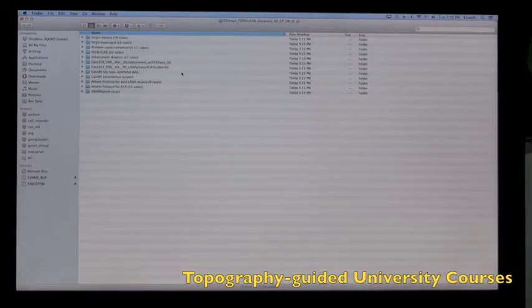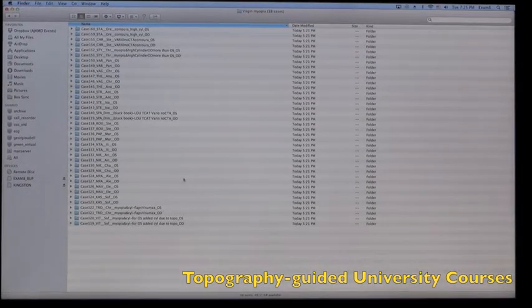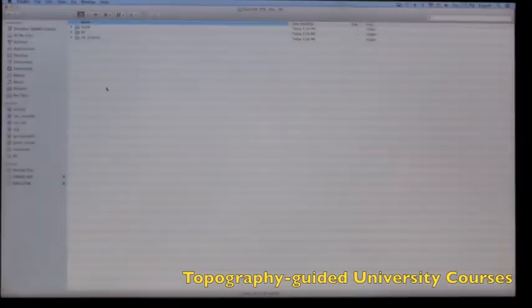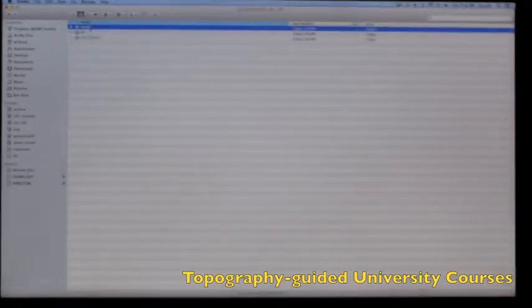Let's go check a myopic case. So we'll open our first folder. There's about 38 cases there, and we'll pick a case at random. So we'll click on one case at random. Thank you. And here you see three folders. One folder says pre-op. One folder says OR and the date of the surgery, and one folder says PO, which stands for post-op. So in the pre-op, we'll click on the pre-op file.